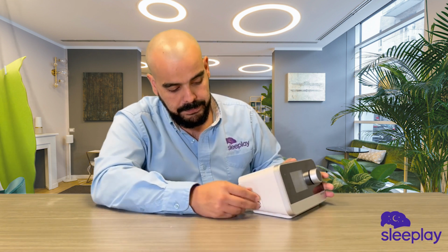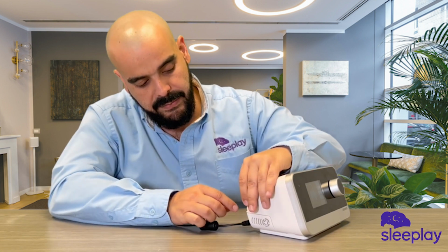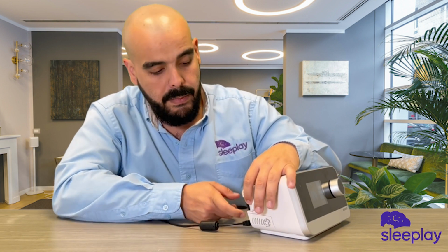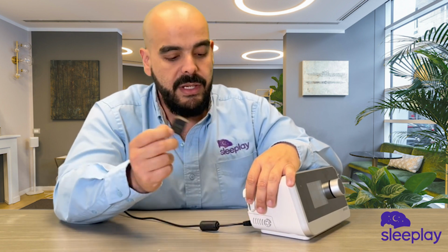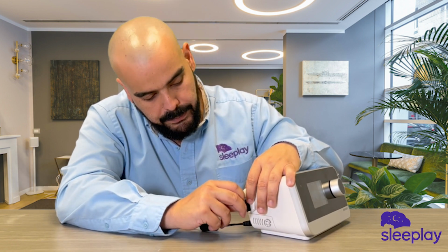Me specifically, I've had trouble trying to get the app to work, and I know other patients have had similar issues. So what I recommend there is to go around that and make sure that you use your SD card. Your SD card is located on top of the filter, and it's very simple. All you have to do is press it in and it comes right out, so you can have all your sleep data.